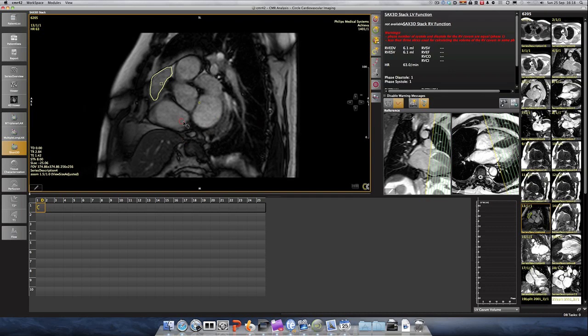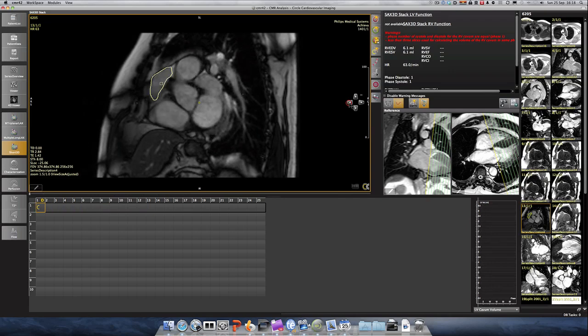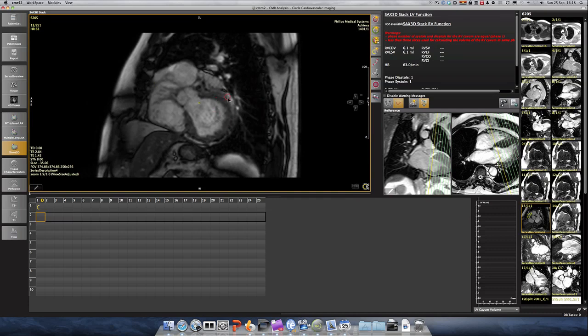And if I just go through into systole, I can see immediately that it changes into the shape of the right atrium. So the left ventricle we wanted to look at as well. That looks like it's the left atrium, so I wouldn't include it. One slice further down, myocardium, myocardium, myocardium, more than 50, maybe 270 degrees. I would include that as my basal slice, but because it's not entirely round myocardium, I would choose this contour.